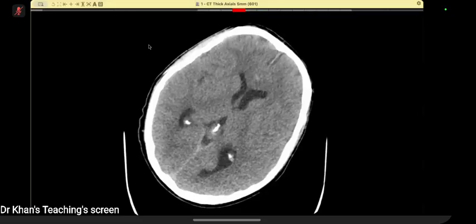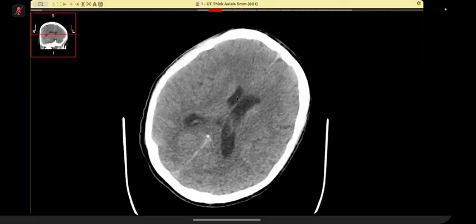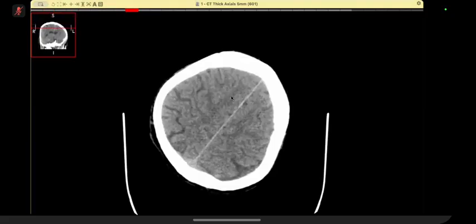Can you ask for the mouse? Who's the candidate? Yes, good evening, sir. Can you ask for the mouse? You know how to ask for the mouse? Yes, sir, I know how to ask, but today the option is not showing up. Okay, so let me scroll.